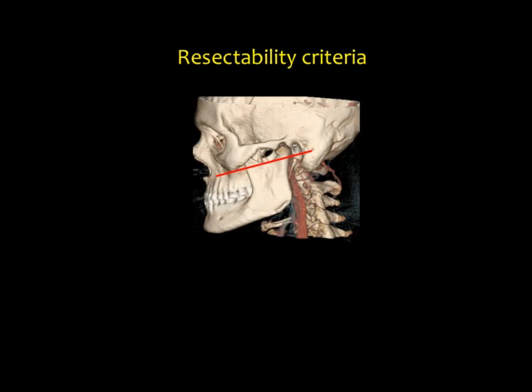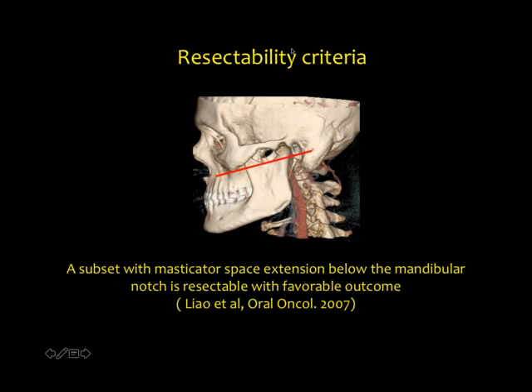The only two areas where the acquisition may change the whole picture are the larynx, with the thyroid cartilage and the paraglottic space, and the sigmoid notch. If you are in doubt because the acquisition is not proper, then you use the coronal in the larynx and the sagittal at the sigmoid notch. Any disease above the sigmoid notch is disease extending into the high infratemporal fossa.